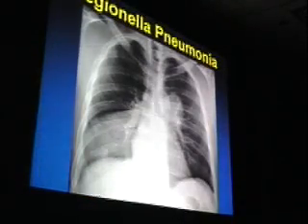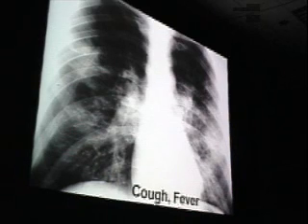This turned out to be Legionella. Here's a patient with more scattered multifocal areas of airspace opacity. There are probably areas of more interstitial abnormality here. This is one of the reasons that the distinction here from interstitial disease by radiograph or even by CT can be fraught with hazard on occasion, because we know that pathologically both compartments can be involved in either process, in processes that we consider either interstitial or alveolar.